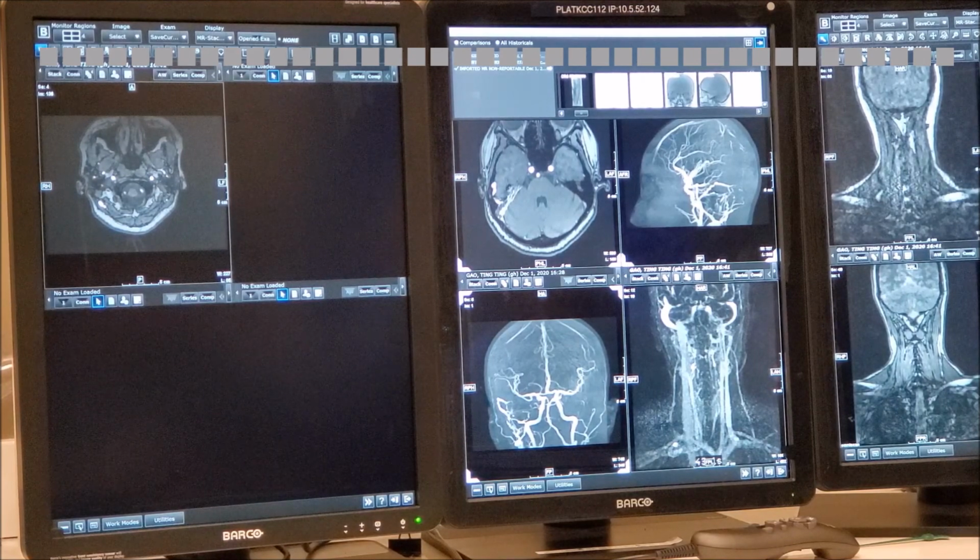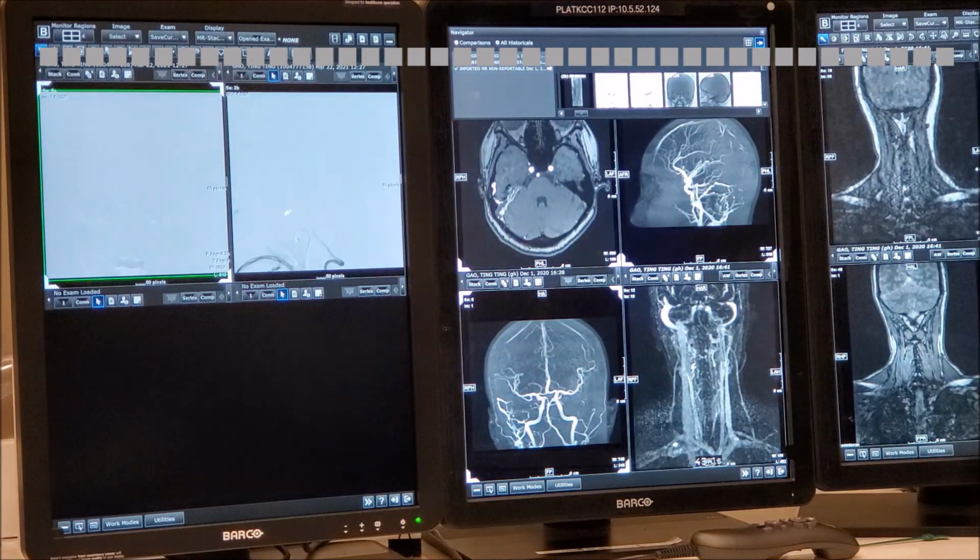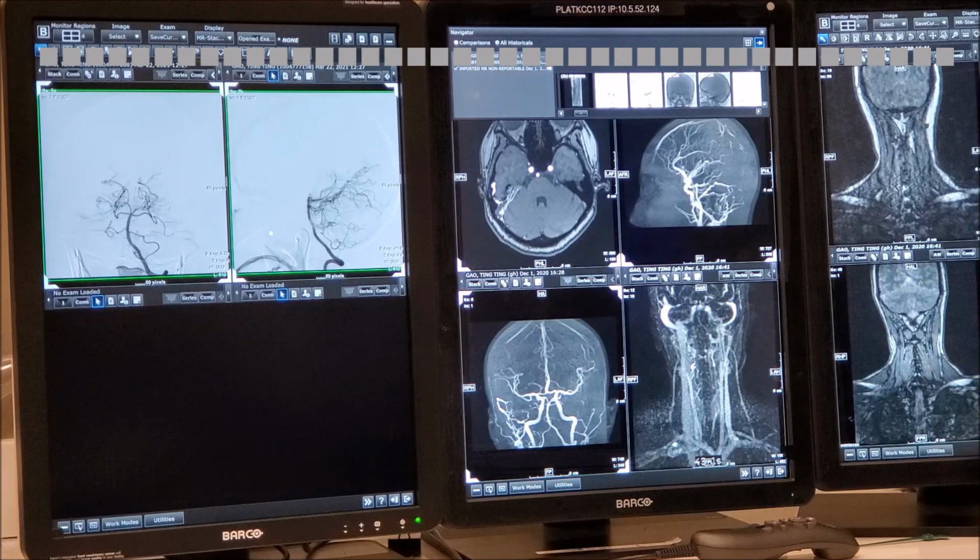What is the blood supply to the region? I mean, it's mostly from external, from the dural surfaces. Yes. I wouldn't say external because that's too simplistic. It is dural supply.